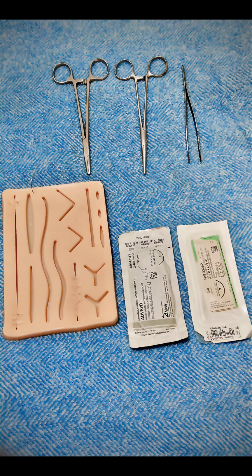Suturing is one of the most fundamental skills every medical student and intern should learn. However, before we start placing the stitches, it is important to understand the material we work with. In today's video, we will learn what is suture, difference between suture and a needle, types of suture material, how to read a suture pack, and importance of needle curvature.